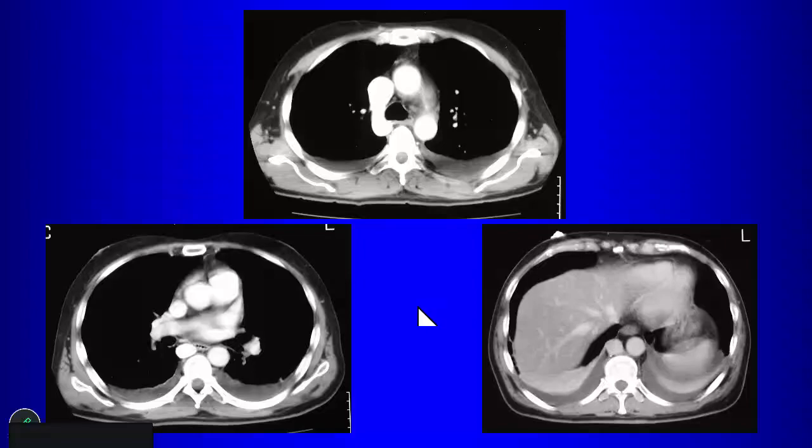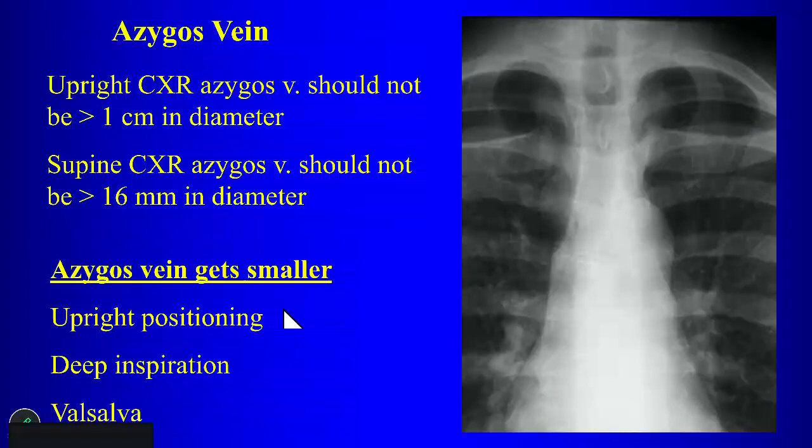So where do the hepatic veins drain? Where do they go? They're the hepatic veins. Where are they going to go? They come to the right atrium, or? They do go up to the right atrium. They form a smaller IVC just before it joins the right atrium, right? But the IVC actually inside the liver itself, you're not going to see.